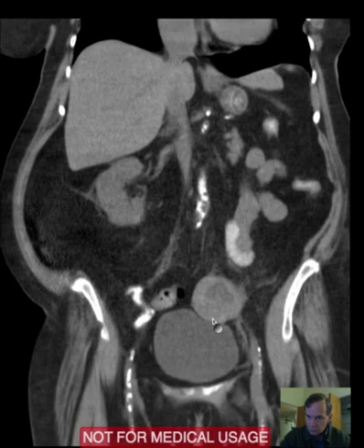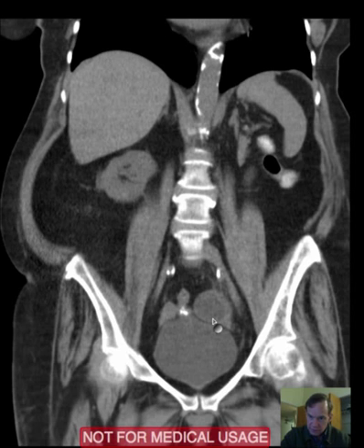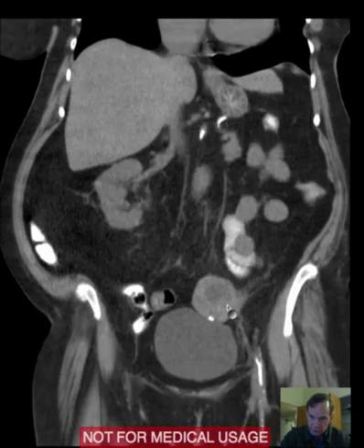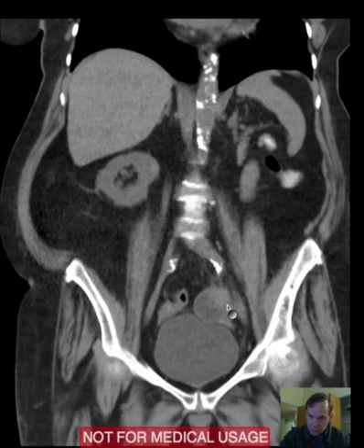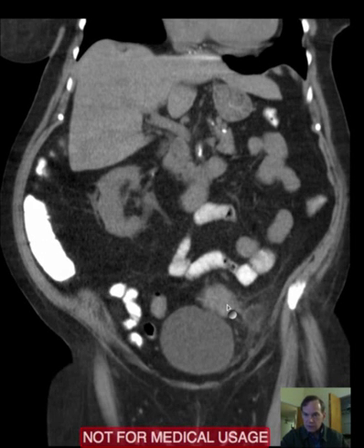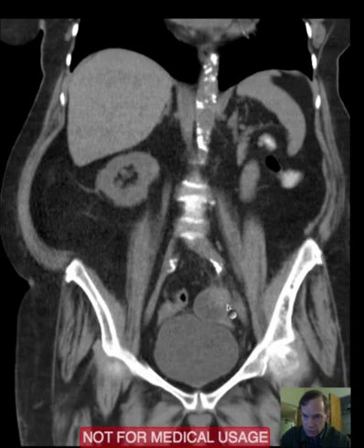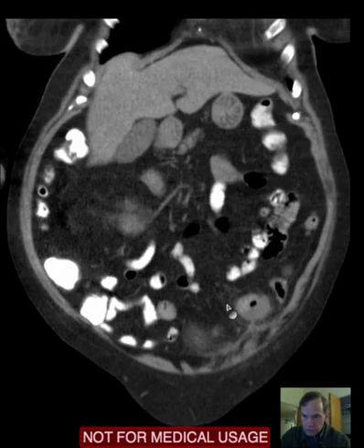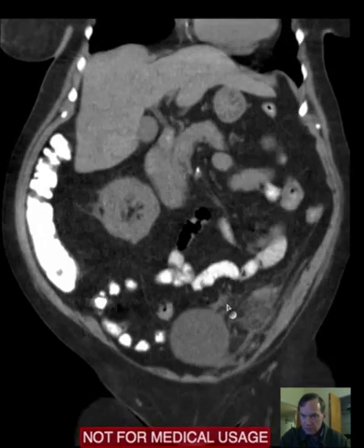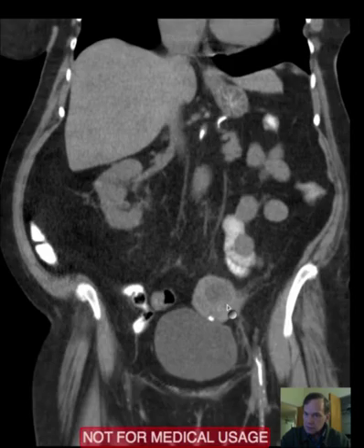Calcification, renal calcification, that it's hard to identify the collecting system, but this looks like this is a cyst associated with that kidney, or maybe it's part of the collecting system. Very hard to tell because the anatomy of this left pelvic kidney is distorted because of its abnormal location. So this is a case of epiploic appendagitis with an incidental finding of a pelvic kidney.